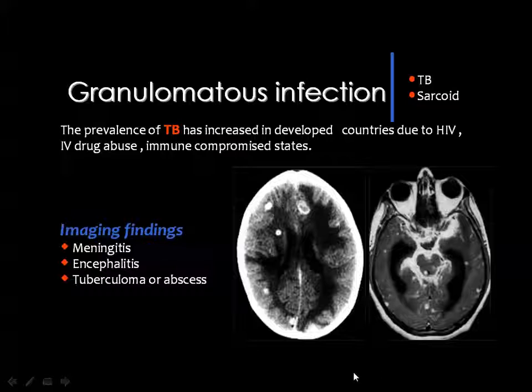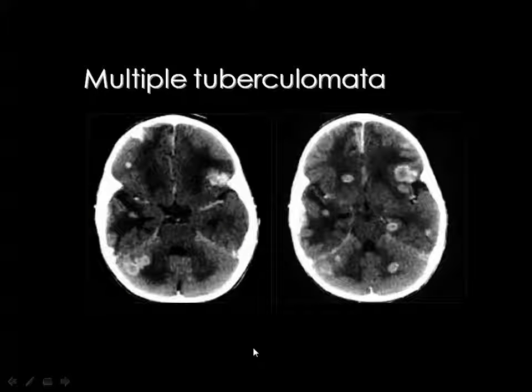The tuberculomas are similar to small brain abscesses, with what is known as the buttonhole appearance. You see, this is a classic appearance of tuberculoma. It is similar to a small abscess with a thick enhancing margin, but the contents are usually relatively hyperdense due to the caseous material inside. They do not contain liquid pus like bacterial abscesses. And this is multiple brain tuberculomas by CT showing the typical appearance, and you can easily appreciate the buttonhole or ring, the thick enhancing ring around these lesions.